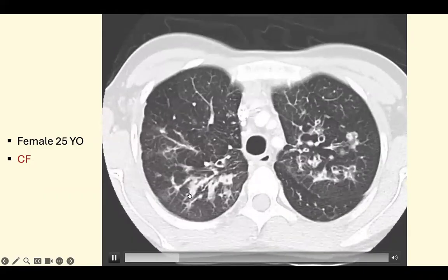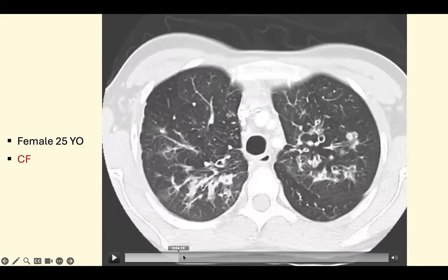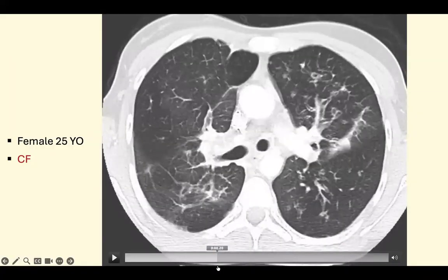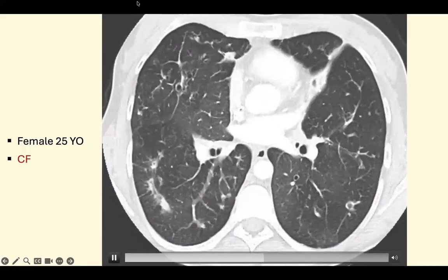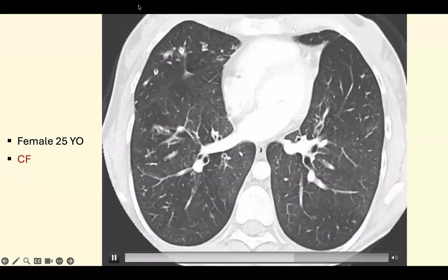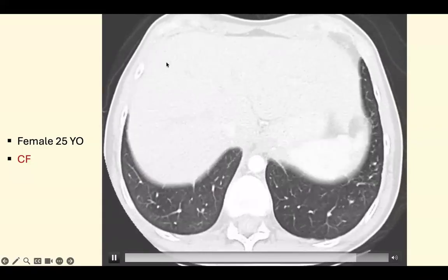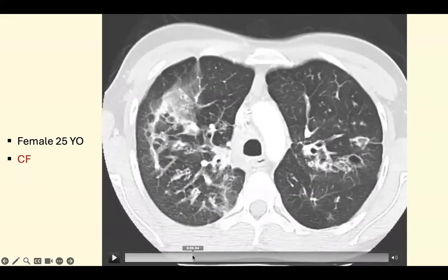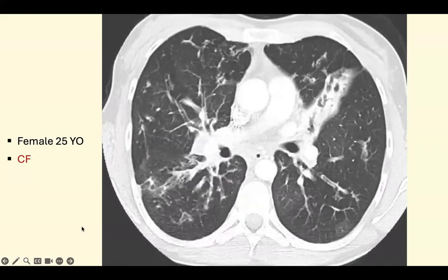There are cavities indicating another superimposed infection causing this, and most likely it is tuberculosis here. The important thing in cicatricial consolidation is the presence of loss of volume. It will cause cicatricial atelectasis, from its name, it will cause atelectasis and loss of volume. Here we cannot appreciate the presence of loss of volume. Let's proceed to the next.